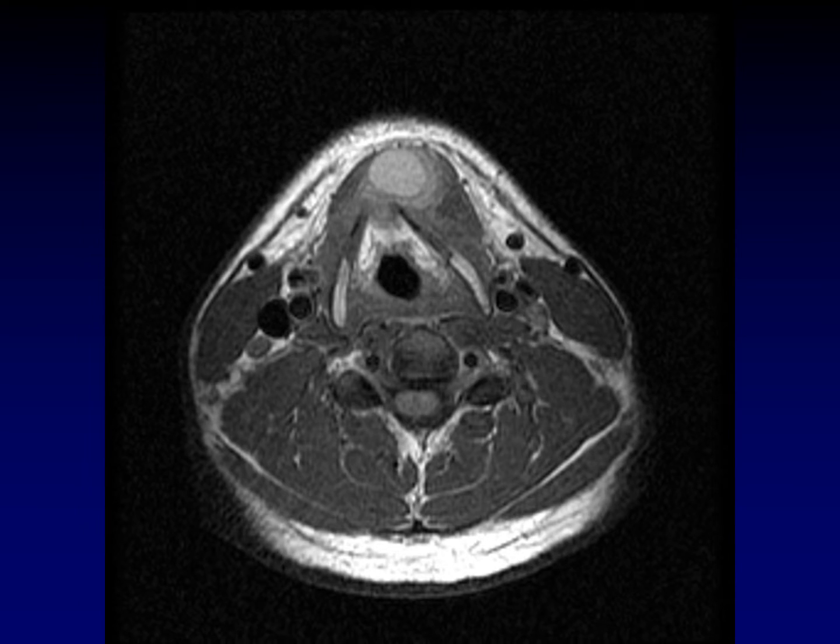Here's the same look on MRI. Here is a thyroglossal duct cyst just off midline in the anterior neck. Note how the strap muscle comes up and claws around the cyst, right? That intimate relationship with the strap muscle. This cyst is bright on this T1 weighted image. That tells us that there is proteinaceous debris within the cyst itself, presumably from recurrent infections.